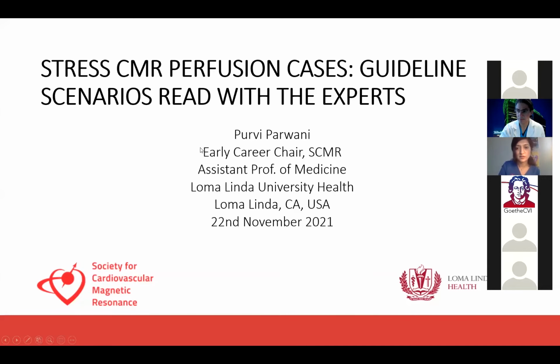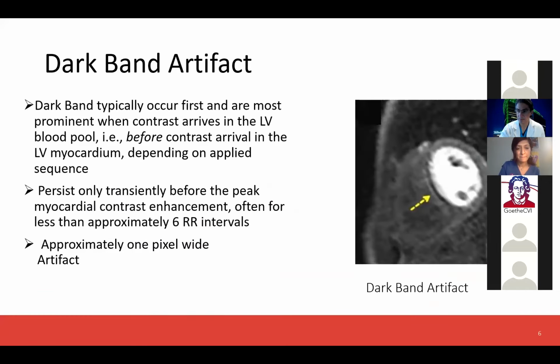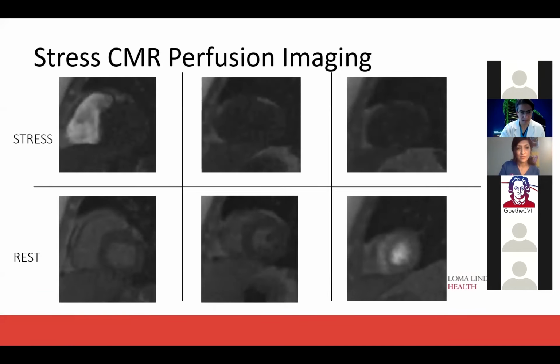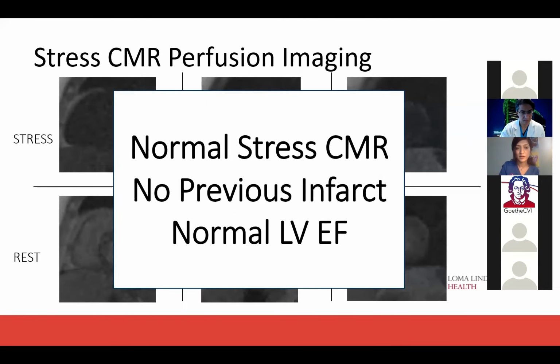Perfect. So if you can just forward it to case 2. Keep going. Yeah. So as I said, this was a patient with normal stress CMR, no previous infarct, and normal LV ejection fraction. No further investigations were performed.